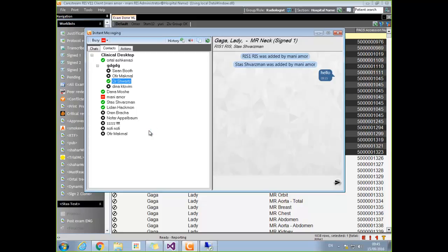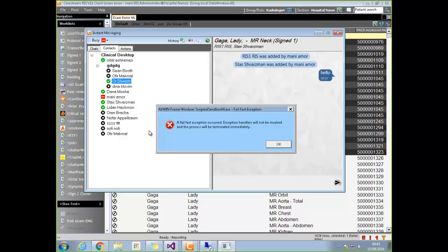In V11, we can automatically create a user inside the RIS upon first log on when it's using Active Directory, and V11 uses authorization from Active Directory as well as authentication now. So there is a possibility to do that. But there's a lot of preferences and things like that that aren't set up with that, so not a lot of sites really use that.